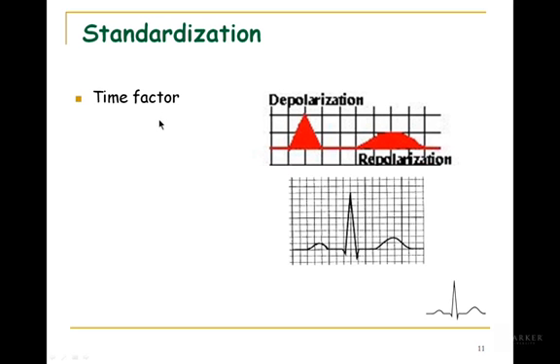But there's something else that may play a role in the recorded voltage that you get. Timing is another one. Now, if you notice for the QRS complex, you look at the R wave versus the T wave. Both of them involve ventricles. This is depolarization of the ventricles. This is repolarization of the ventricles. Same amount of muscle that's involved. So I have to state that another thing that will determine the overall magnitude is the amount of muscle that's involved. So if you notice, the P wave is going to be way smaller than the QRS complex because the atria are smaller than the ventricles.